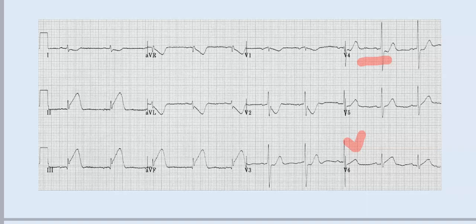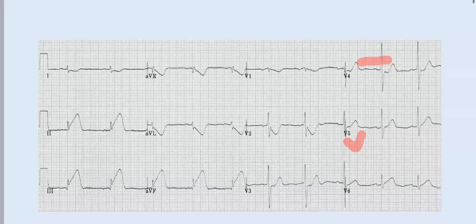We have ST segment depression in V2 and AVL, and AVR as well. So what does that mean? We may have an inferior posterior. Because of this V2, I have a high R, ST segment depression, and T-wave inversion in V2 that might indicate posterior. I'm going to tell you why. But basically, I have inferior plus or minus posterior extension.